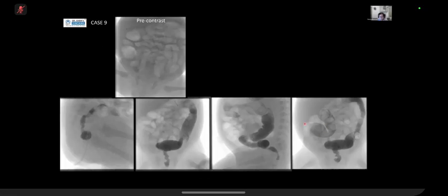Are these just bowel loops that I'm looking at? Because for me that looks like your sigmoid, your descending, your transverse, and that's your ascending colon. So that's probably your cecum, and those are small bowel loops interposed over each other. That could be cecum because they're the same region.